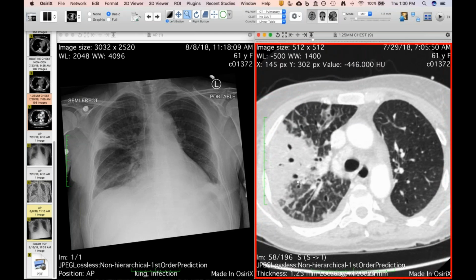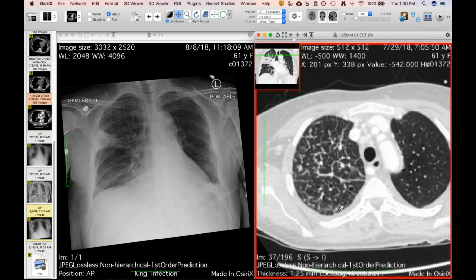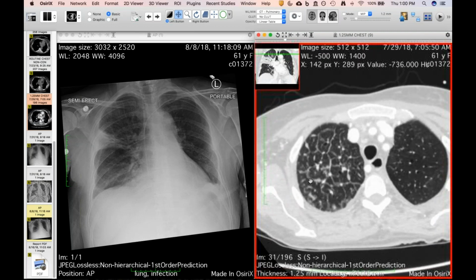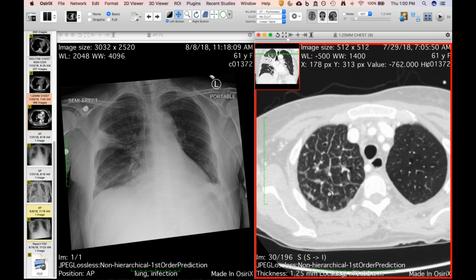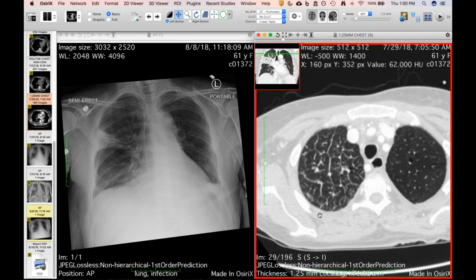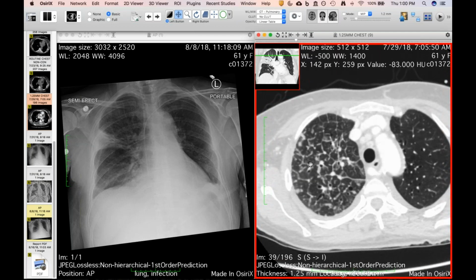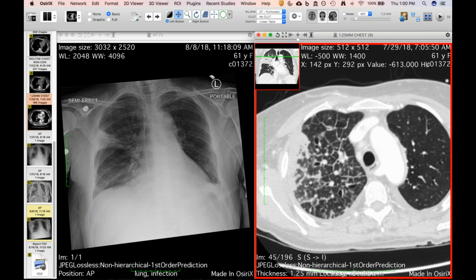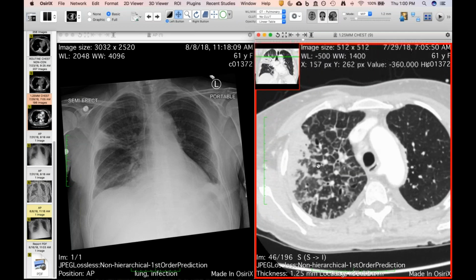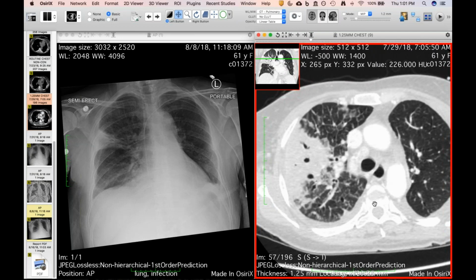I was starting to think of pulmonary veins, but now I don't know. It's a very dramatic interstitial edema. The question is why. And of course, I don't know. Maybe I just never was seeing these, but until you mentioned the presence of the venous lakes a few years ago, or the lymphatic pearls, I was not that cognizant of them. But we see them now pretty frequently with edema, and I don't think this is lymphangitic spread of her leukemia lymphoma or anything, because it was too rapid, and there's too many other findings of edema, too many areas that are smooth septal thickening, and it just got better so rapidly just with antifungals and diuresis.